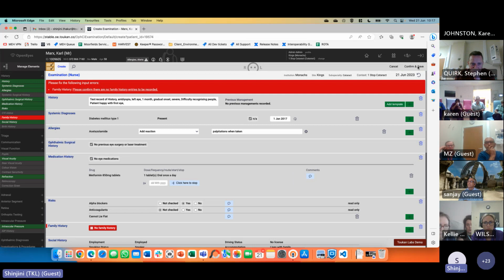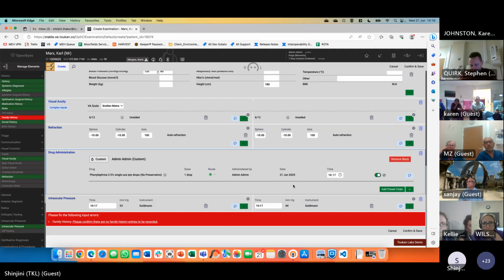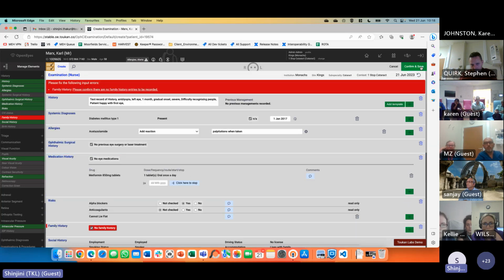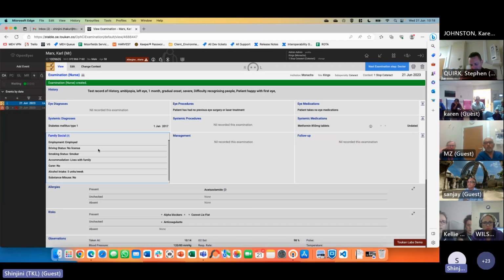And if I've forgotten something, it will remind me, hey, you forgot this field. And when I go there, I had forgotten to say no family history, or I hadn't added any family history. So I've done that now, and I'm going to click confirm and save. And that's my examination recorded.